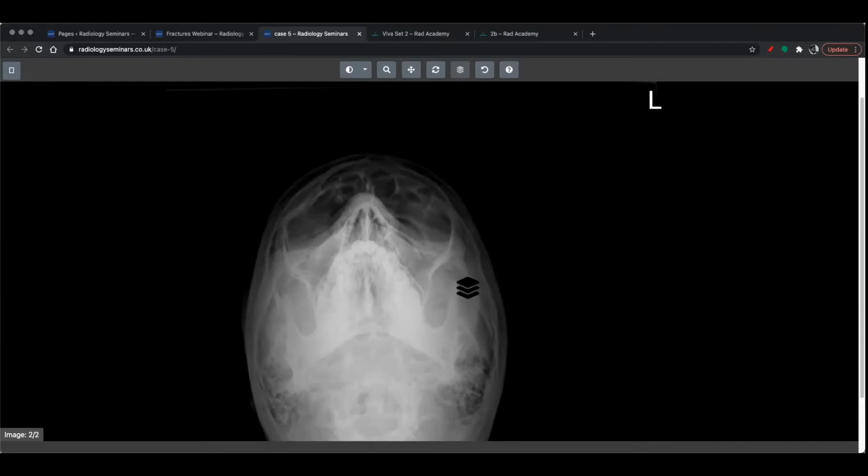But I just want you guys to know that you're going to want to be looking at everything else on the x-ray, okay? You want to have a look at that mandible. You don't want to miss the mandible. And also, can you see that little cheeky peg sitting there? You don't want to miss those kinds of things. I know it's not the reason why I've got the x-ray, but you do want to be looking at the other things. So let's say you've seen the abnormality, look at everything else as well. Make sure you've had your check areas. You've looked at the things that other people won't see, because that's essentially what radiologists are there for, aren't they?